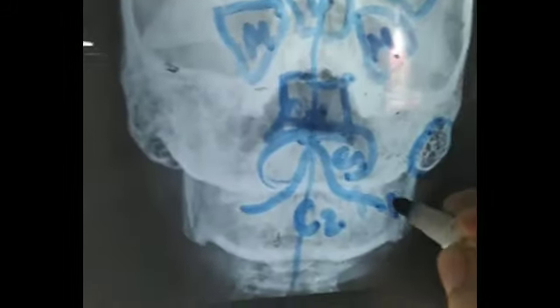Next thing what you can see here is the odontoid process of C2 spine, where it gets attached with the C1. This odontoid process can be seen only in C2, and that is why we have to give the angulation so that it won't come to the area of interest. Next, this is the mastoid area and these are the mastoid air cells.